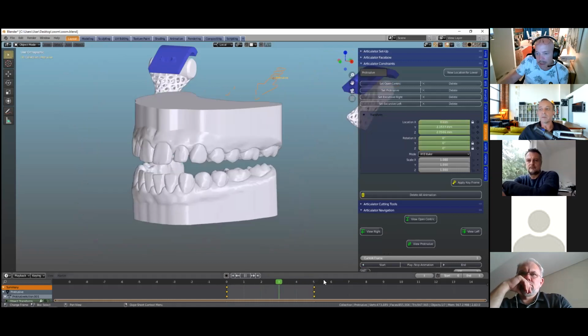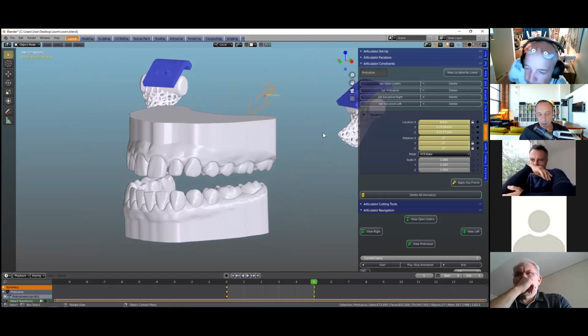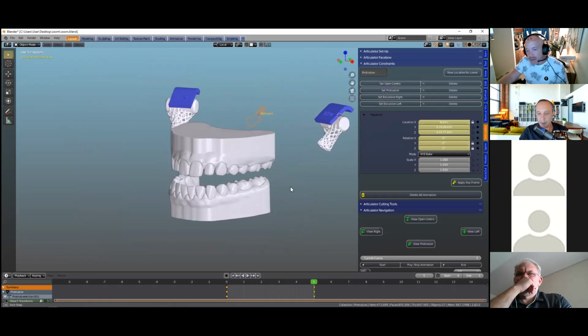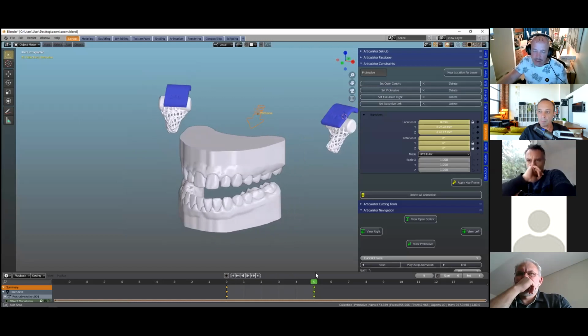Okay, so nothing? Michael, the auto button that you pressed earlier on, that basically brings in the condyles, opens the bite slightly, and sets the articulator at default values. Correct? Yeah, that's correct. But those default values do not mean that it's good for what you are trying to do at the moment.